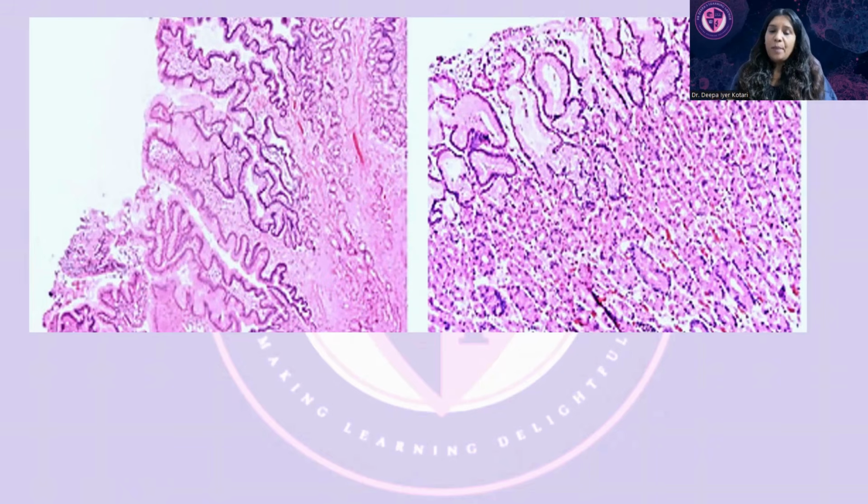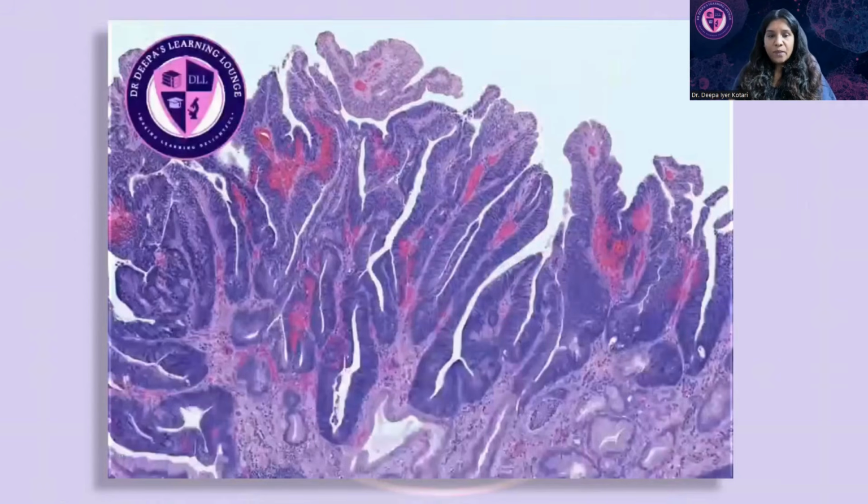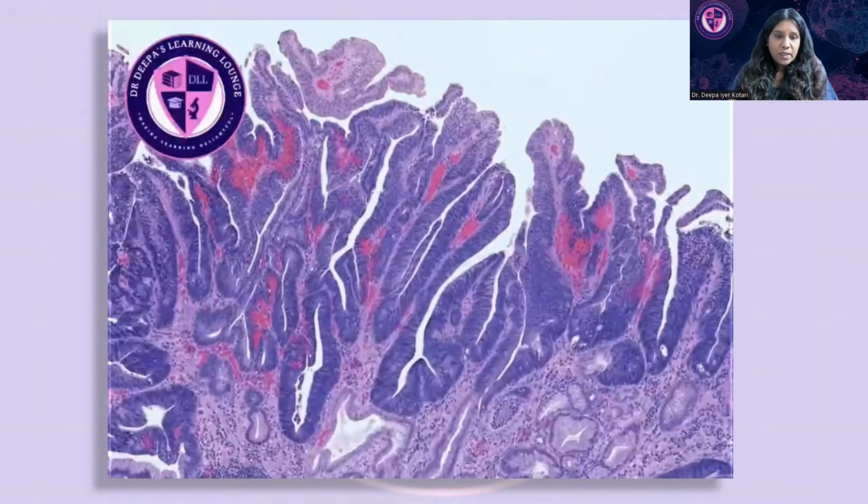So goblet cells are required to make the diagnosis. So never confuse an intestinal metaplasia and dysplasia. They are entirely different. Okay. So now let's look at the case that I showed you. This was a whole slide image that I showed you.